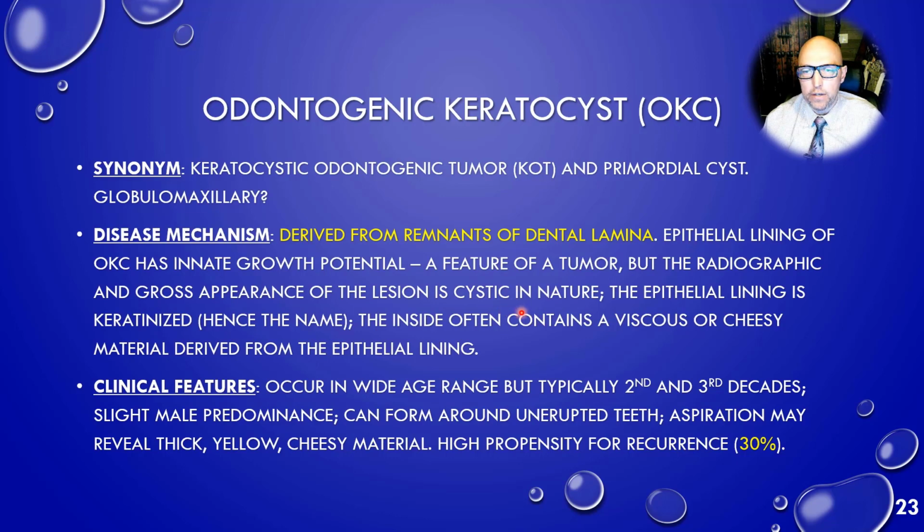I mentioned how this has gone back and forth between being classified as a cyst or a tumor. Radiographically, it has a lot of qualities of a cyst. It looks like it could be a sac of fluid, but it also has an inherent growth potential inside the lining. And so it does have tumoral and cystic type features.